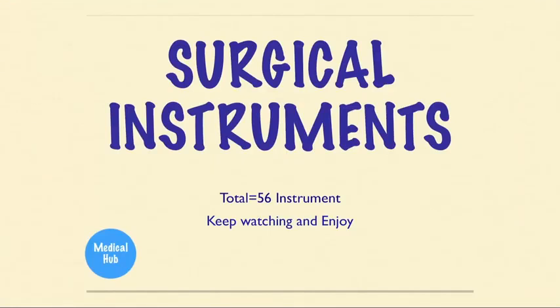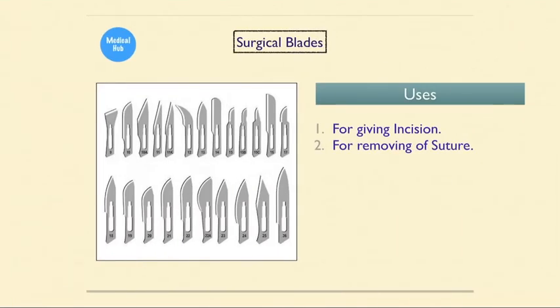Okay, so hello friends, today we will discuss the surgical instruments. We will discuss surgical instruments' names and their uses. We will discuss a total of 56 instruments. Okay, so let's start. We will start with the surgical blades.